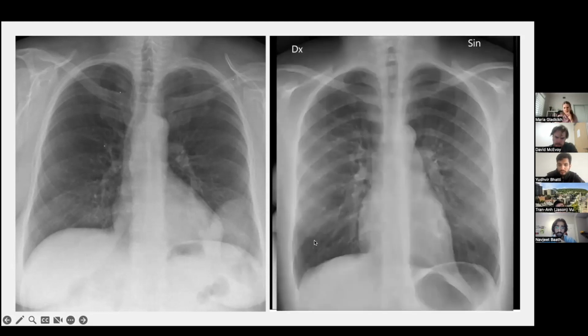And if you look at a normal X-ray, we don't really have things that are hyperdense, running through the heart. There are some vessels, but this is a bit too thick to be a regular vessel, okay? So that's making me think that there is some sort of communication going on here. And indeed, this turned out to be an arteriovenous malformation. Arteriovenous malformations are typically within the lower zones of the lung, and patients usually present with hemoptysis. Sometimes they can present with shortness of breath, but hemoptysis is usually the main presenting complaint.